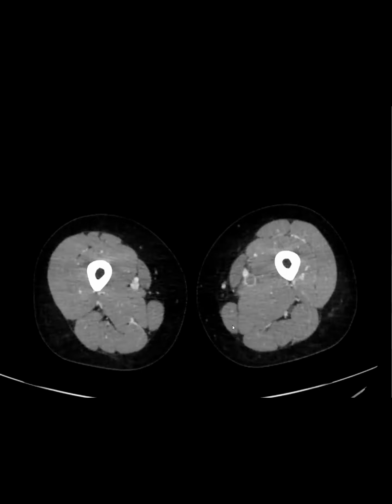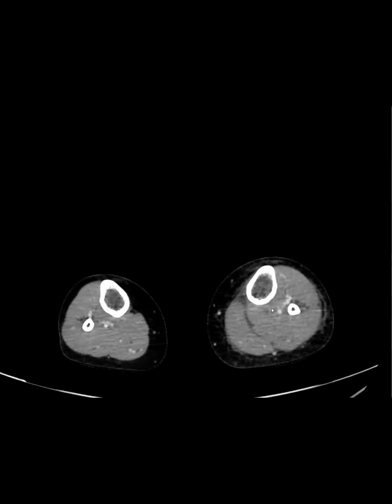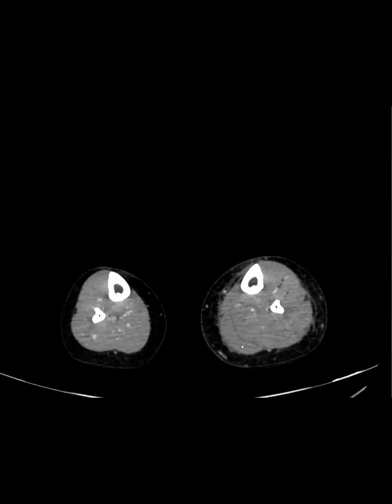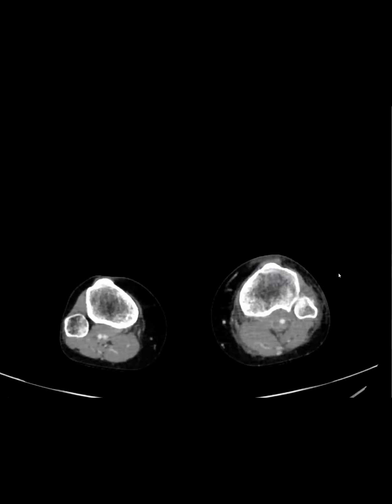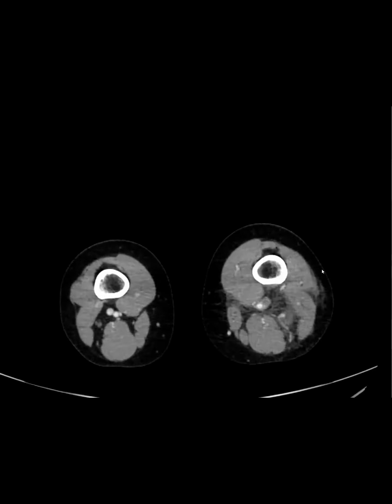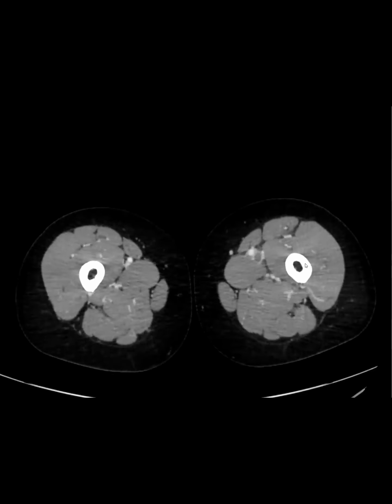And the DVT went all the way down the leg. So we actually did a veno runoff and it went all the way down here. So you can actually get a really nice venogram of the leg. Somebody's writing into the chat. Yeah, Maria got it. So it's May-Thurner syndrome. This is more common in younger females.